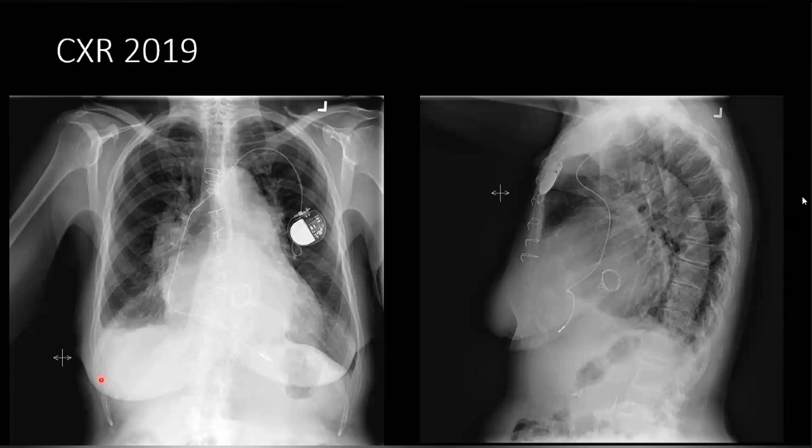Okay. Moreover, I can see there is a mitral valve replacement in situ in the lateral radiograph. So I think the patient has been operated on for mitral valve disease, and now I can see there is a resolution of... I can still appreciate the left heart border enlargement, but it is slightly resolved as compared to the previous one. And pulmonary arterial hypertension is also there. So what do you think about the prosthesis?